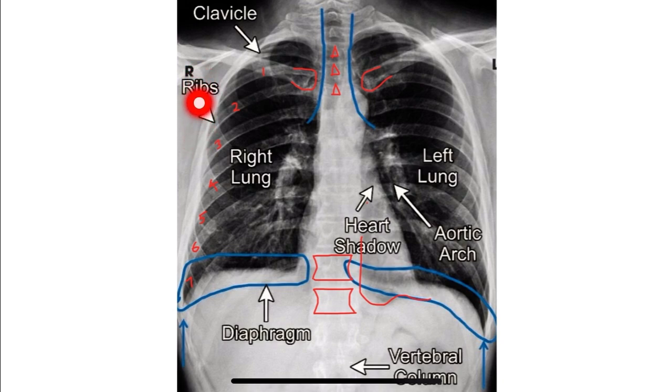And we are also looking for any soft tissue changes or any subcutaneous emphysema, or also any foreign bodies suggesting like pacemakers or any implant.